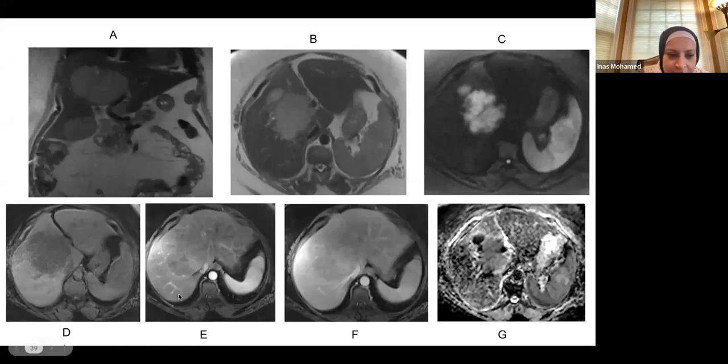And the other thing, I don't know if you're going to appreciate, is that they are huge, and they are not really invading anything. It's just pushing the vessels around, which is a very peculiar thing for lymphoma. You can even look at the small bowel, and there is a humongous mass in there, and it's just not doing anything. There's not even bowel obstruction. So lymphoma everywhere looks the same. It has this mass effect, and it very, very rarely causes any obstruction or invasion.